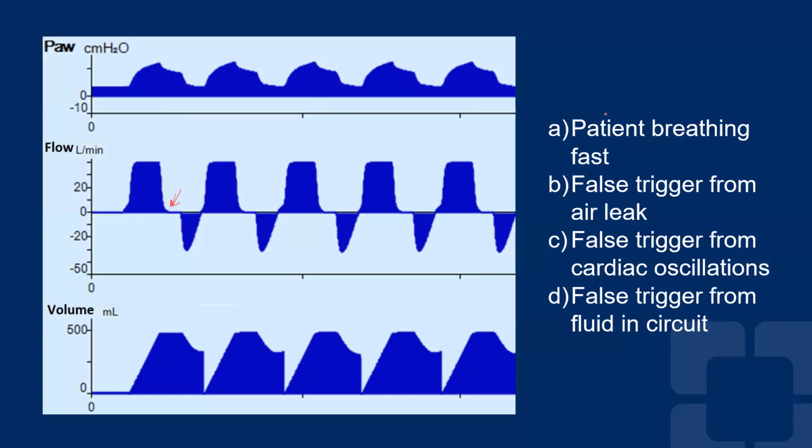It can be early cycle, meaning that the inspiratory time set by us is shorter than what the patient wants. Late cycle doesn't cause multiple trigger. Actually, it causes a completely different item. It doesn't cause double breaths. And finally, you see early or reverse trigger. So early trigger meaning that the machine triggered first and then the patient.